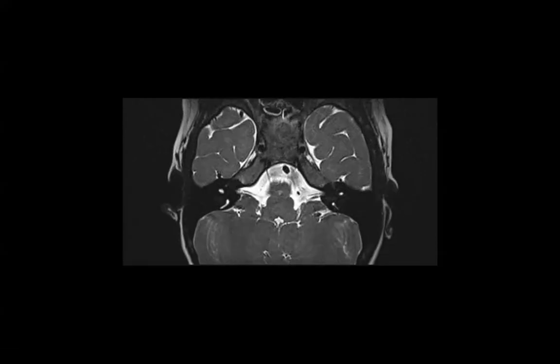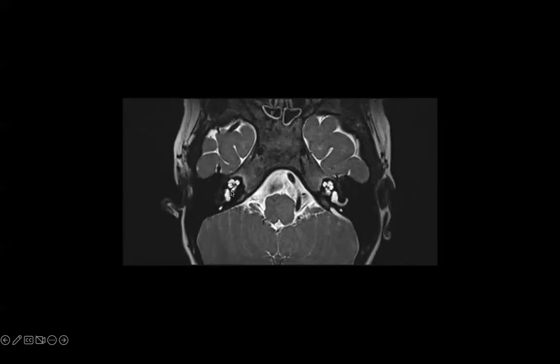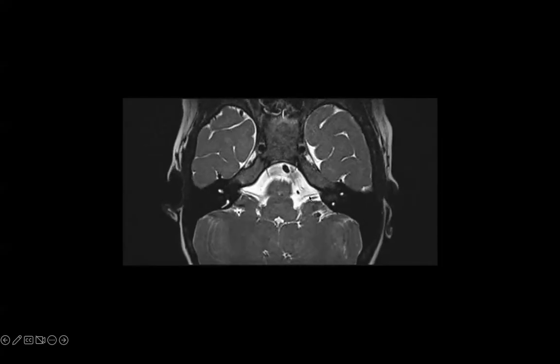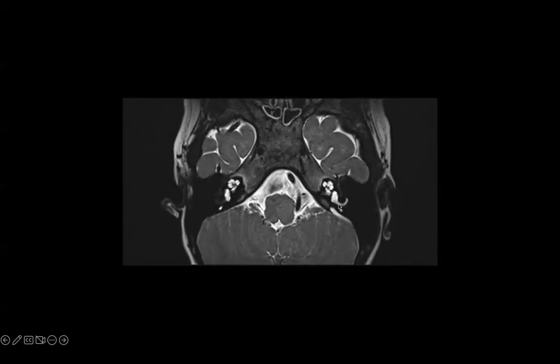So you can follow this thick nerve in the canal, and then there is the separation between cochlear branch and vestibular branch. So this is very, very important. And you can see on the other side the same cochlear and vestibular branches, and then you go back and you see also the seventh nerve that is half of the size of the eighth nerve. But in this case, there is a unilateral abnormality with hypoplastic modiolus here and enlargement of the vestibular aqueduct, or rather endolymphatic sac, because we are on MRI.